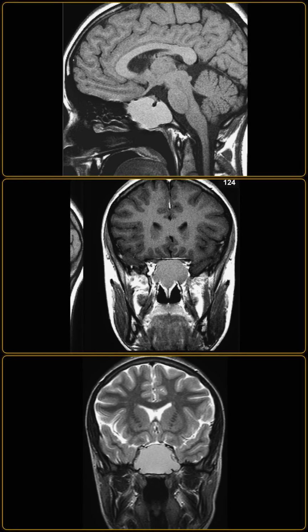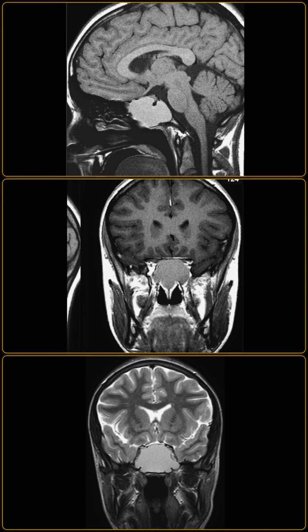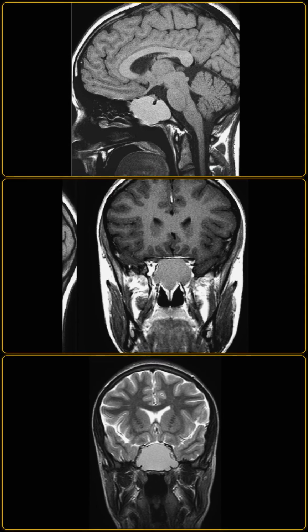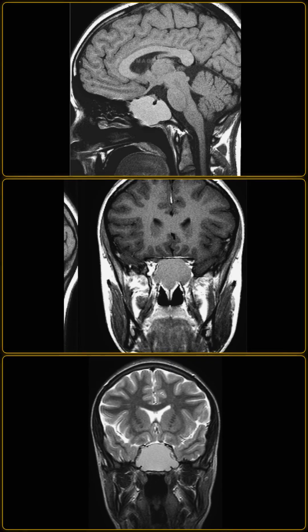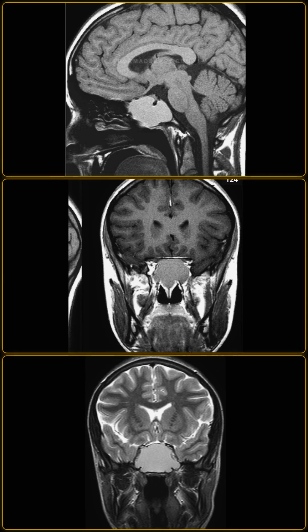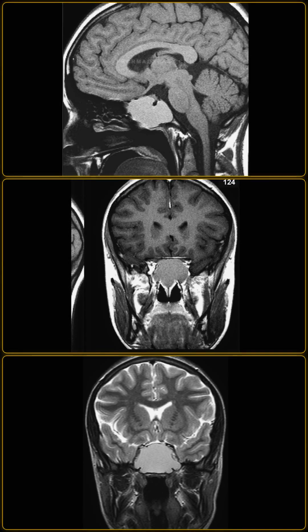The brain MRI demonstrates marked expansion of the sphenoid sinus, which is filled with abnormal soft tissue signal rather than normal air. The sinus contents show mild, uniform hyperintensity on both the T1-weighted and T2-weighted sequences. This T1 hyperintensity is characteristic of proteinaceous or highly viscous fluid.